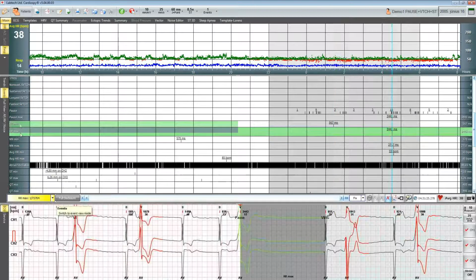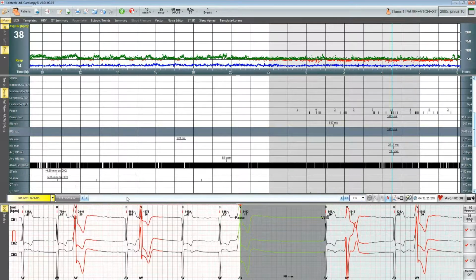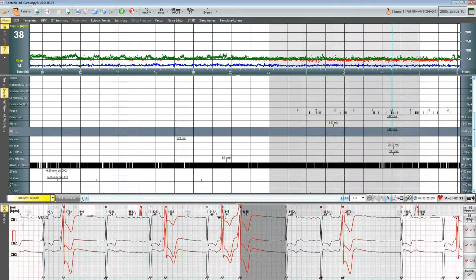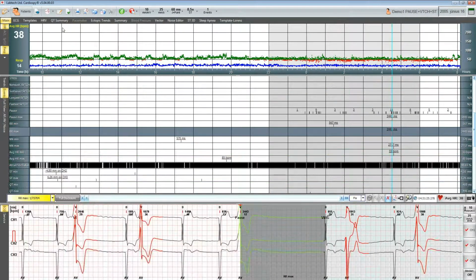And it's the same with RR max. Now we have a huge pause here, so I won't edit it, but it works similarly, in a descending order. You can also do this in another menu. It is also a good function. You can find it in the HRV tab.